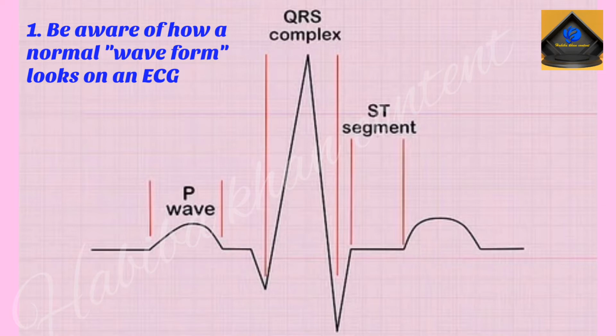The P wave is a small semicircular shape. The QRS complex is the tallest, most visible aspect of the ECG trace. It is usually pointy, like a tall, thin triangle, and very easy to recognize. It represents the electrical activity of the ventricles, ventricular depolarization. The ventricles are the two large chambers located at the bottom of the heart that forcefully pump blood throughout the body.